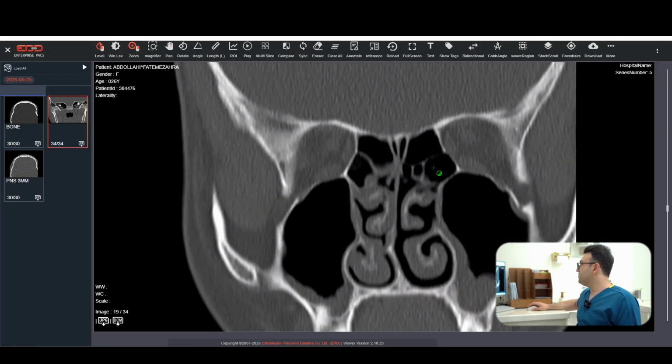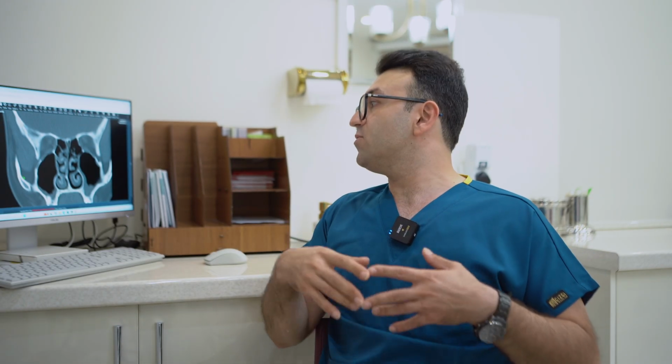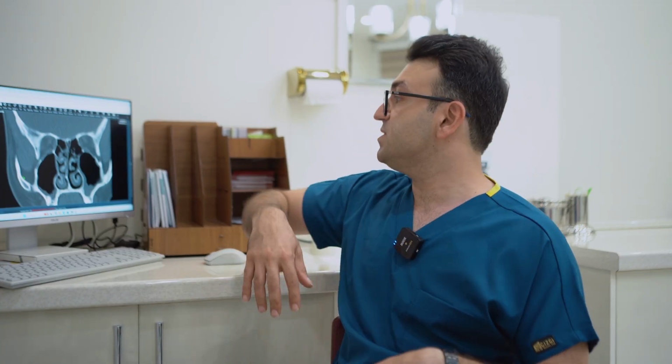And after that, we try to evaluate the sinuses, okay? In the maxillary sinuses, I see chronic inflammation of the Schneiderian membrane. It shows that mild sinusitis is there for the patient. So we should be very careful about that and try to evaluate the patient. Maybe the patient has received some kind of antibiotics before that, or another surgery maybe is necessary before the nose surgery.